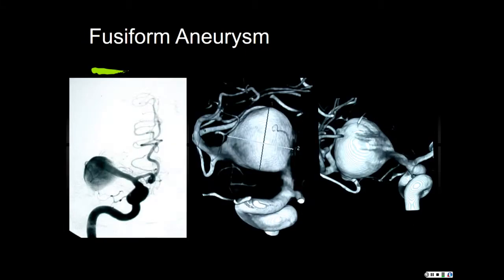Here's some examples of actual aneurysms that we imaged in fellowship. Pretty darn big. The fusiform aneurysms, basically picture a hose and picture sectional widening of the hose. Okay? You can't coil those. You cannot coil those. They require the work of a neurosurgeon.